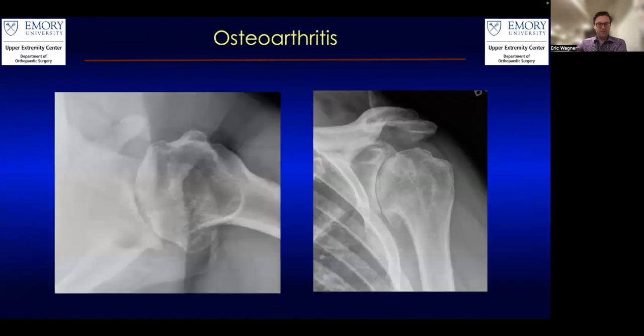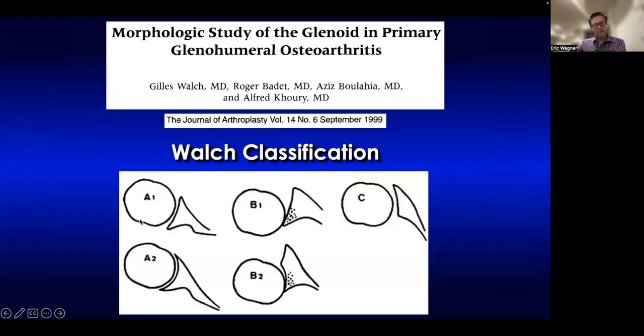So osteoarthritis, this is sort of classic. You can see it kind of translates backwards. You can see this goat's beard osteophyte. So you have posterior subluxation. You have this goat's beard osteophyte. You can see the narrowing of it here.